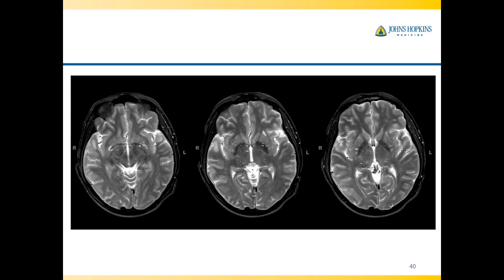In this patient, let's look at these images. These are T2 weighted images showing numerous tiny prominent CSF intensity spaces in the basal ganglia and the thalami bilaterally. Now, this is kind of non-specific because this can be prominent perivascular spaces. On the other hand, Cryptococcus does involve the perivascular spaces and can result in abnormal distension of the perivascular spaces. What you want to notice on these particular images is the abnormal T2 and FLAIR signal in the right superior temporal gyrus. So there is an additional involvement of the parenchyma beyond the basal ganglia in this patient with cryptococcal infection.